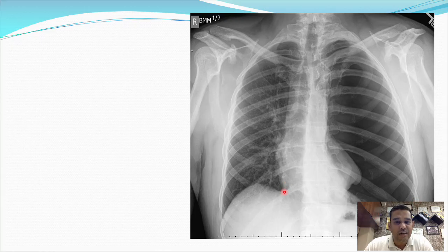Now comes the cardiac shadow, the heart. You could appreciate the heart shadow. This is the right atrium and ventricle of the patient. This is the left-sided heart. Whatever heart you see, it seems to be okay to me. Next, the dome. This is the right dome of the diaphragm. There is no radiolucency under the right dome of the diaphragm, and this is the left dome of the diaphragm. There is no radiolucency under the diaphragm, so this is okay.